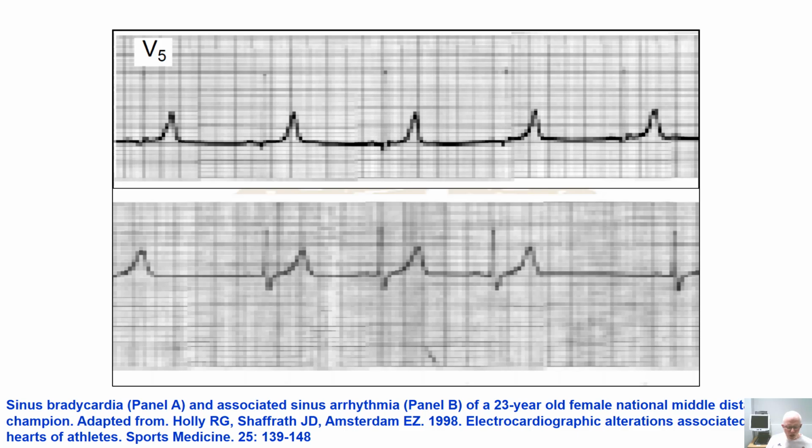But if you look below, you can see the arrhythmia. Can you see that sudden spike? This arrhythmia is relating to when we get the inhalation and the exhalation. And so you can see the breathing pattern is being overlaid on top of the ECG trace. So what we would have is a trained technician who is able to distinguish between what is an arrhythmia and what is some other kind of perhaps more insidious response in the ECG trace.